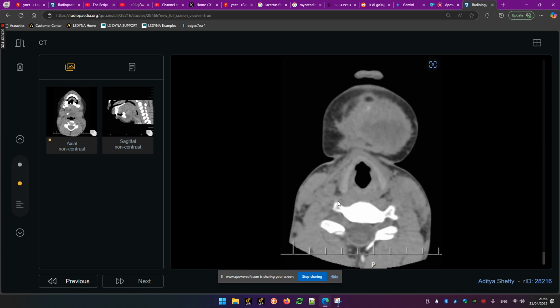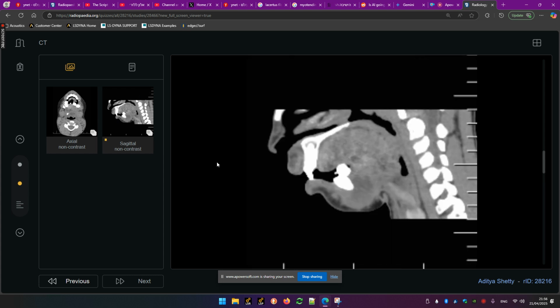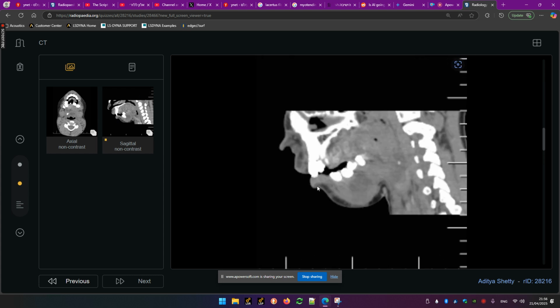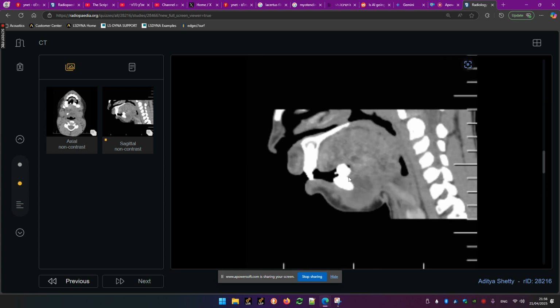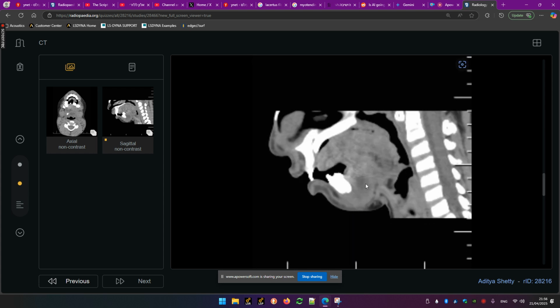But where did it come from? It's so close to the tooth that I think there is some, I don't know, a root decay or something. But I don't see it. But it comes just from here. Maybe there is some radicular cyst that I don't see here that got infected from tooth decay of this tooth. There is something.